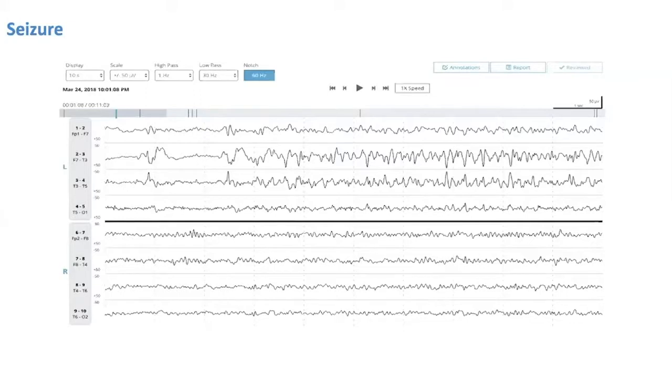And here I'm seeing a change in distribution. It's becoming more broad. I'm seeing a change in amplitude, and I'm seeing a change in frequency. It's getting a little faster as it goes across the page. Right. Maybe on the next page, we would see that neighboring channels are also being affected, and that would qualify as evolution in space. Great. Go to the next.